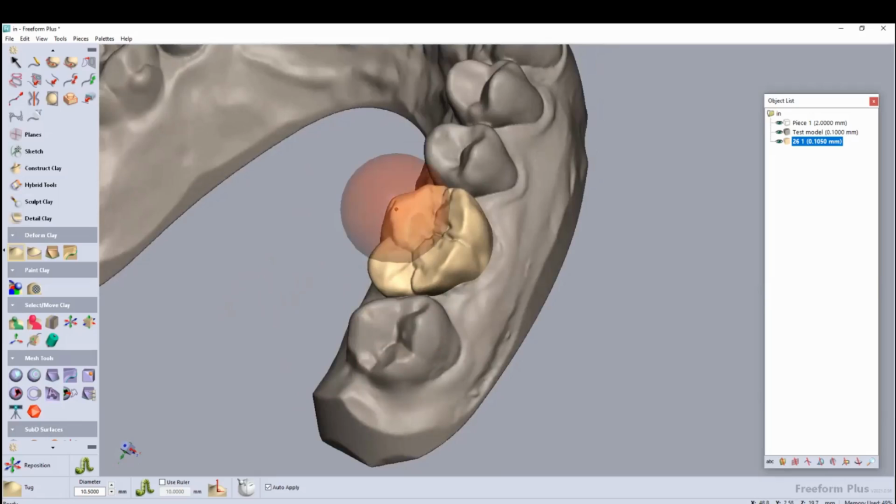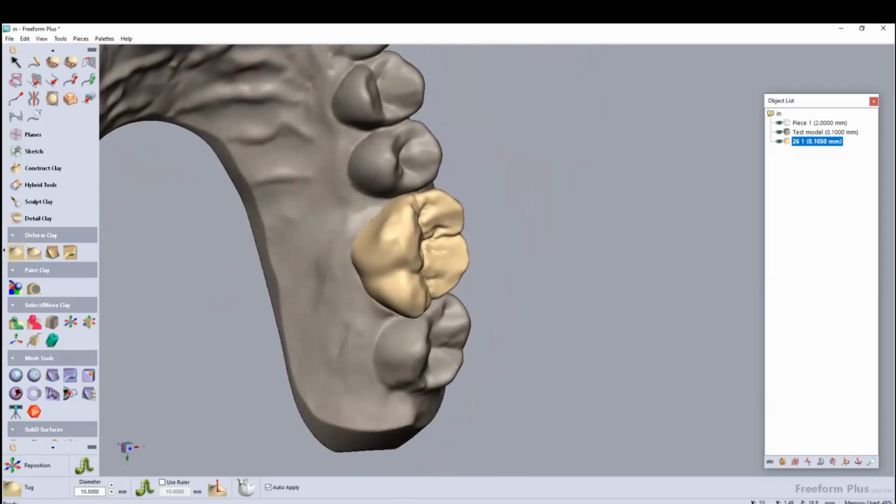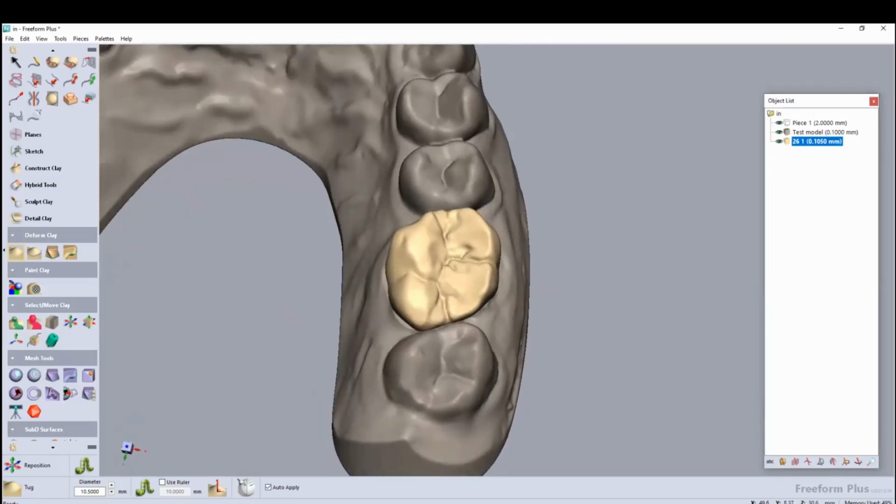This function is very convenient for working in the geometric freeform. I want to tell you that I think geometric freeform is the best tool for sculpting, because I can make not just dentistry objects. I have a hobby, and I make different sculptures of people, and if I want to have some model for printing, for example, I make it in this software.